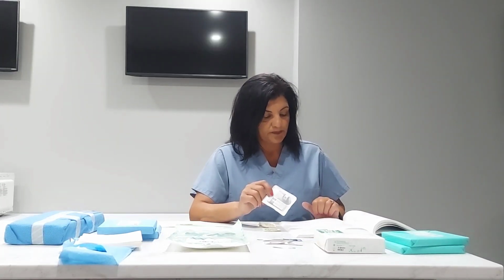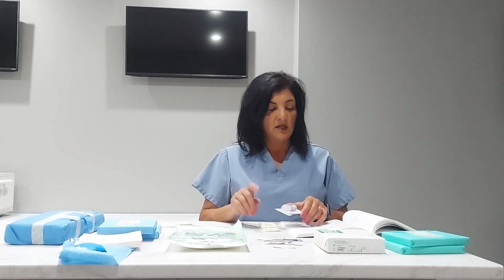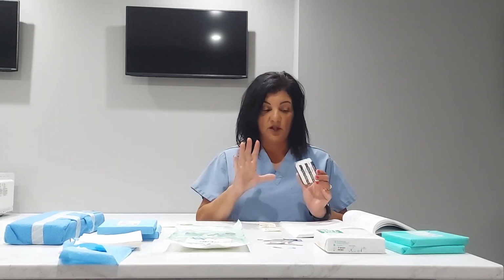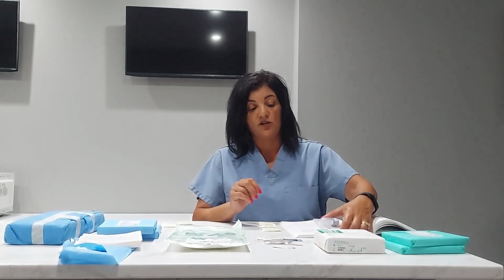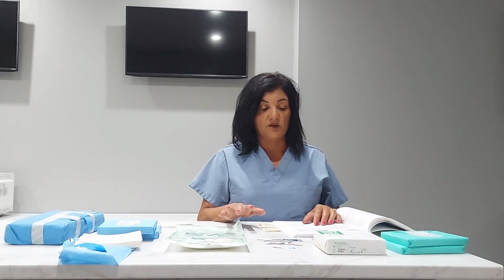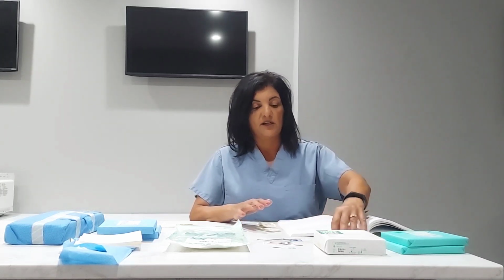So there's a lot of things to know as far as integrator types, process challenge devices, all the visual cues to know that an item is sterile or not sterile. Always refer to your manufacturer's instructions for use on any products that you use, on the sterilizer that you're running, and the process of the instruments that you're sterilizing. So there's a lot of directions to read and follow, but I know you can do it.